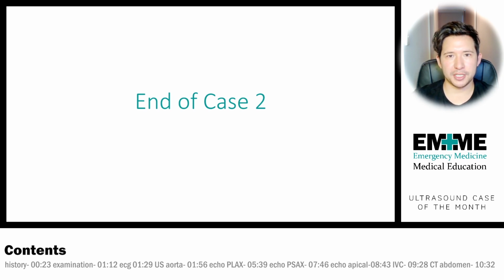I hope you've enjoyed listening and watching and looking through some of the pictures. I hope this has helped you understand what sort of things to look at when you do an aortic scan or when you do a basic echo in the emergency department.